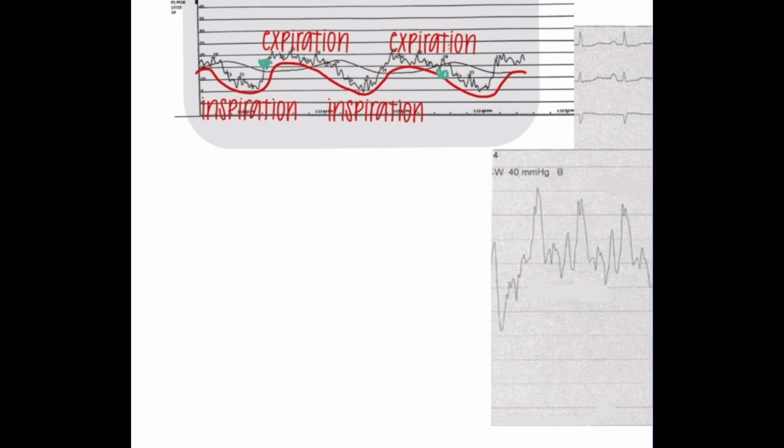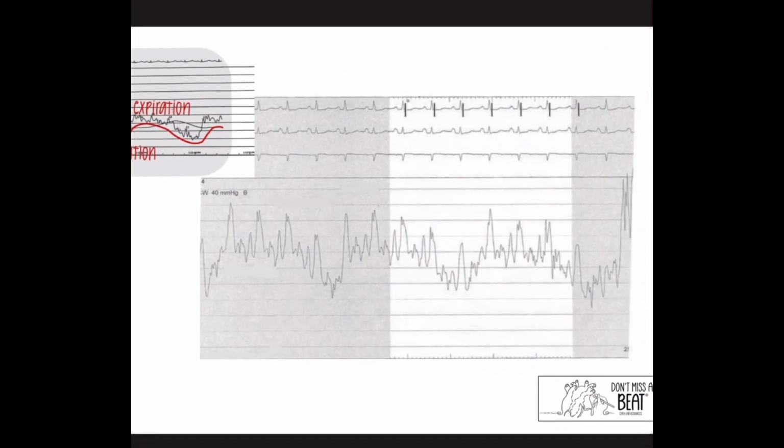What I want you to try to do when you're first learning is measure everything during a single cardiac cycle. Okay, there's a lot that can go on between points A and point B. And of course, some things are average, like FFR and IFR. When you're used to seeing that, it does take a whole screen of measurements and reports out that average. But for this one, you're doing it by hand. You're going, especially for the boards exam, you're going to want to pick one single cardiac cycle to try to identify everything in one moment in time. So we can try to do that here. Now the scale, let's work that out.